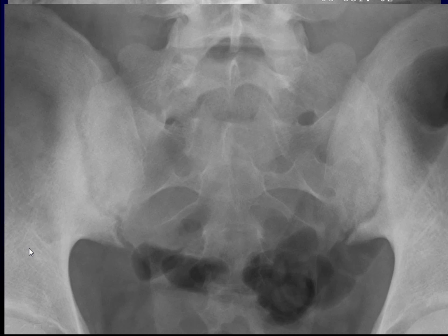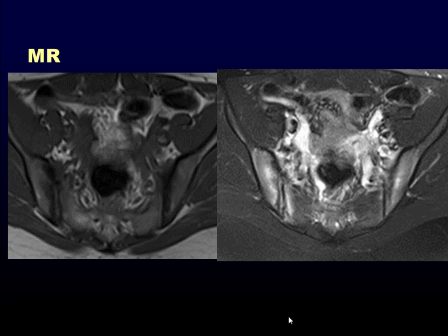Compare that with this patient with ankylosing spondylitis where there's bilateral symmetric erosive disease. The white line is gone because we have a huge amount of osteitis surrounding the joint that's creating a lot of white all the way around the joint. And then look at the joint itself. No longer that smooth undulating, but it's got this beaded appearance from erosive changes on both sides of the joint. It will start worse along the iliac side of the joint, but you'll see this irregularity in osteitis. So contrasting normal with ankylosing spondylitis.